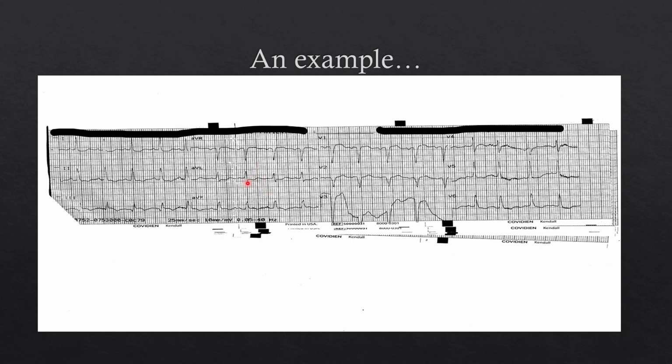And so the T wave, when the patient was healthy, was most likely normal looking and completely upright, and now we're getting a little bit of the sagging in the ST shape. Again, is this enough? Probably not, but should they sit somewhere that can't handle STEMI? Probably not. This is certainly enough to get us motivated to get them where they needed to go.